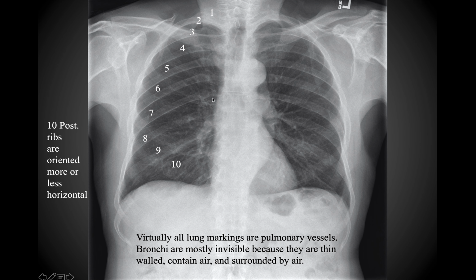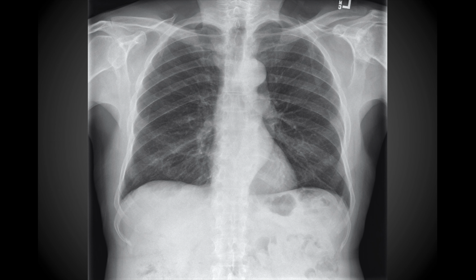And so when you look at the soft tissue throughout the lungs, the pulmonary cavities, you'll notice that again there's kind of these white streaks that you see, and these are all pulmonary vessels. So again, you should see more pulmonary vessels inferiorly, and fewer of them more superiorly, just because the size is dramatically less superiorly in the lungs versus inferiorly in the lungs, and that has to do with gravity.